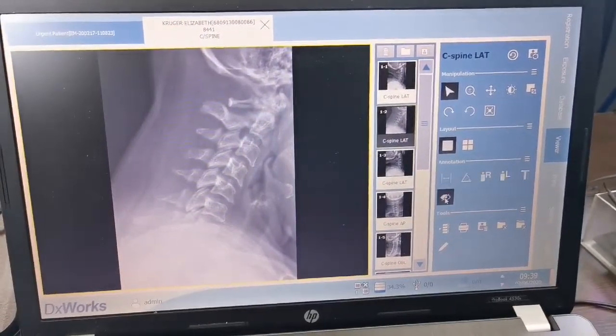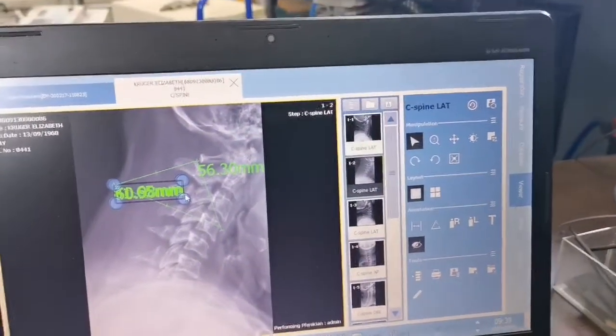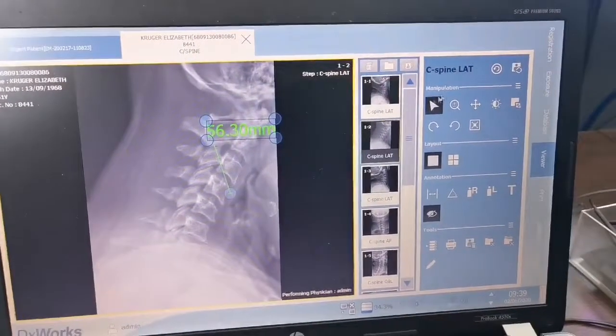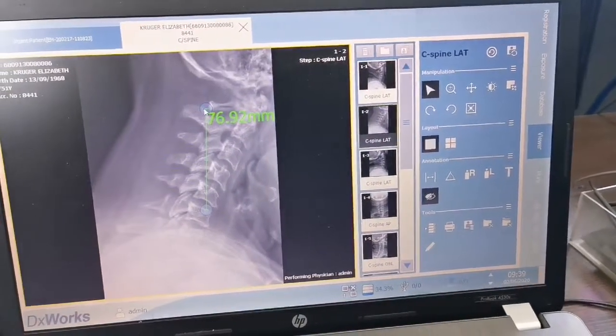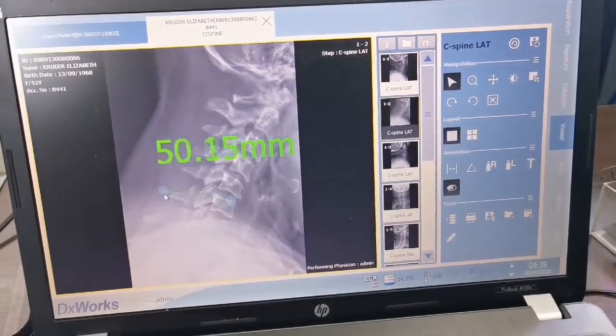Then it hides all the annotations. And then if you want to delete them again, you just press the delete button, then it deletes those ones you selected. Or you can just, with the select tool, move your part 1 or part 2 just to adjust those kinds of things. Not selecting both of them.